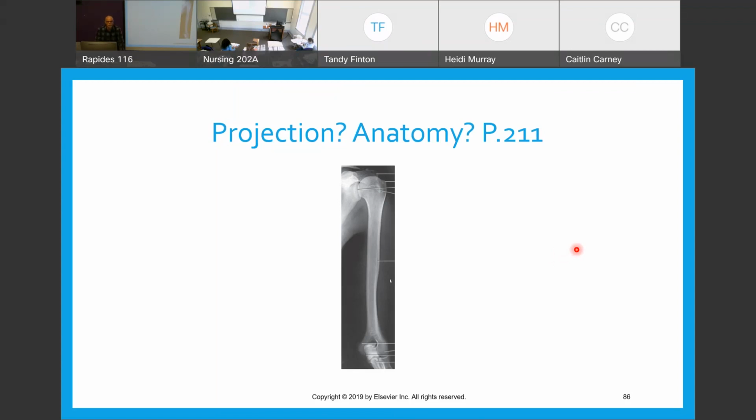Lateral humerus shows the whole humerus. Oh, the epicondyle. There you go. So we see the two epicondyles, and they are what? Parallel to the IR. Do you get this? Who said perpendicular? Be careful with that. That is the key to this. So take your time and really look at that stuff. Yes. Kind of looks like a little AP elbow with a little turn to it, a little pull to the forearm. All right, very good.